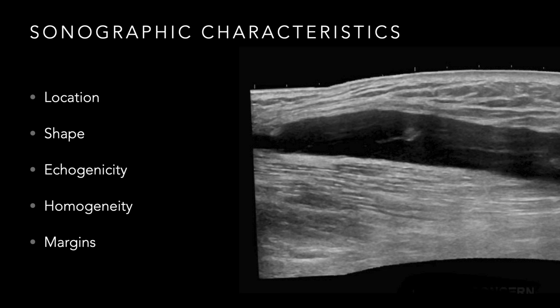So if you imagine you just degloved your subcutaneous layer off of your fascia, right? There's going to be some irregularity, at least to the superficial margin, where you have those lobules of fatty tissue in the subcutaneous layer that are kind of hanging there, right? If you encapsulate that, over time, those margins tend to smooth out a little bit and you have that smooth type of appearance, right?